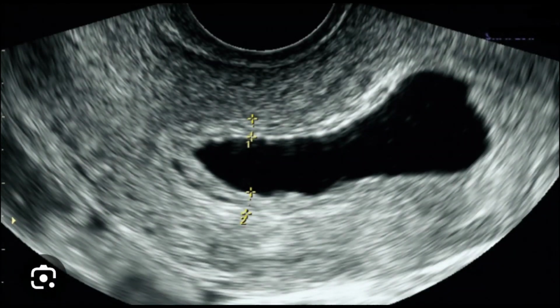But if you find only one of the features, like in that case there is endometritis, fluid filled cavity, still you will be able to label pelvic inflammatory disease. However, the cause is specific, that is endometritis and fluid in the endometrial cavity, but in general the term which will be applicable here would be pelvic inflammatory disease. So it is good to mention endometritis with fluid filled cavity suggestive of pelvic inflammatory disease.